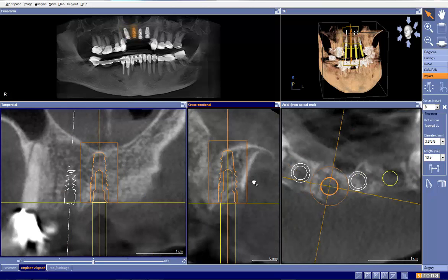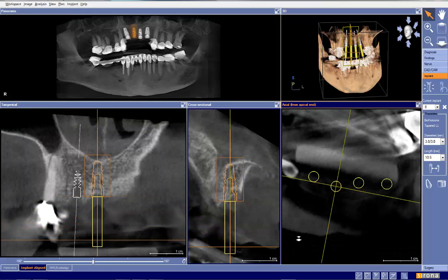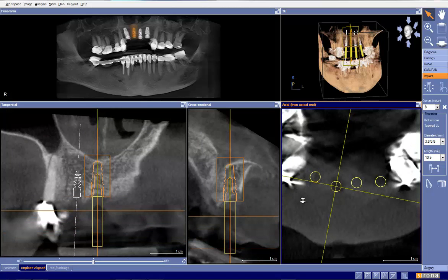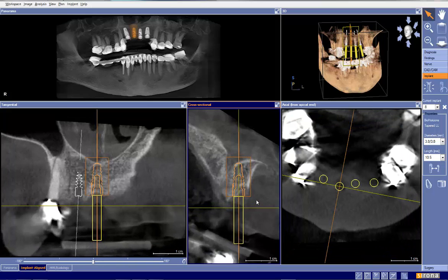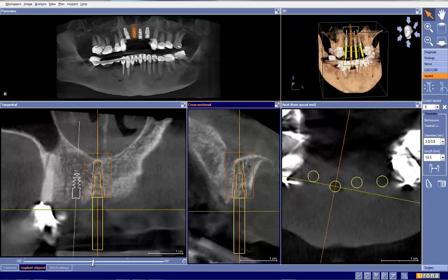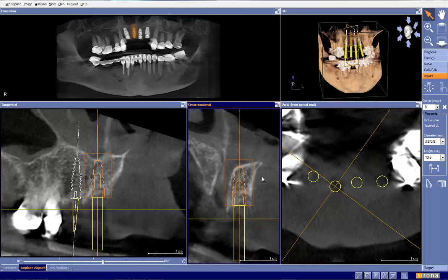Now if we go to site number 8, my guess on this particular plan is that the implant is tilted too far to the buccal. And that's a guess, again, without prosthetic data. It's difficult to know. The other thing that we have to take into consideration here is the location of the Palatine Fossa, which we are right up against here.